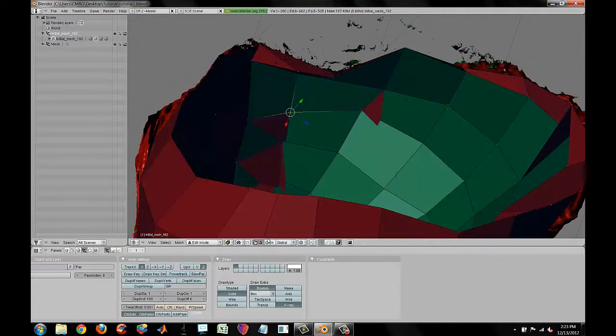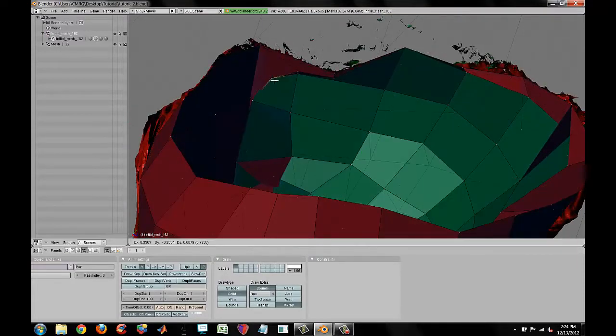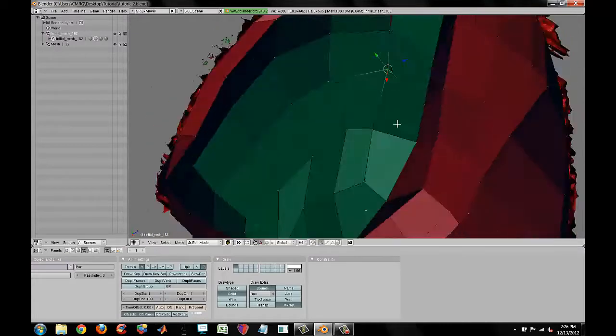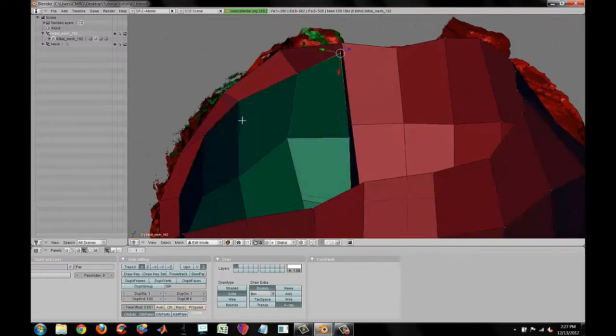Once you've fitted everything, you have to make sure the surfaces are aligned. For example, here the right ventricle with the myocardium. Again, use the wire structure or the transparency to make sure it is aligned.